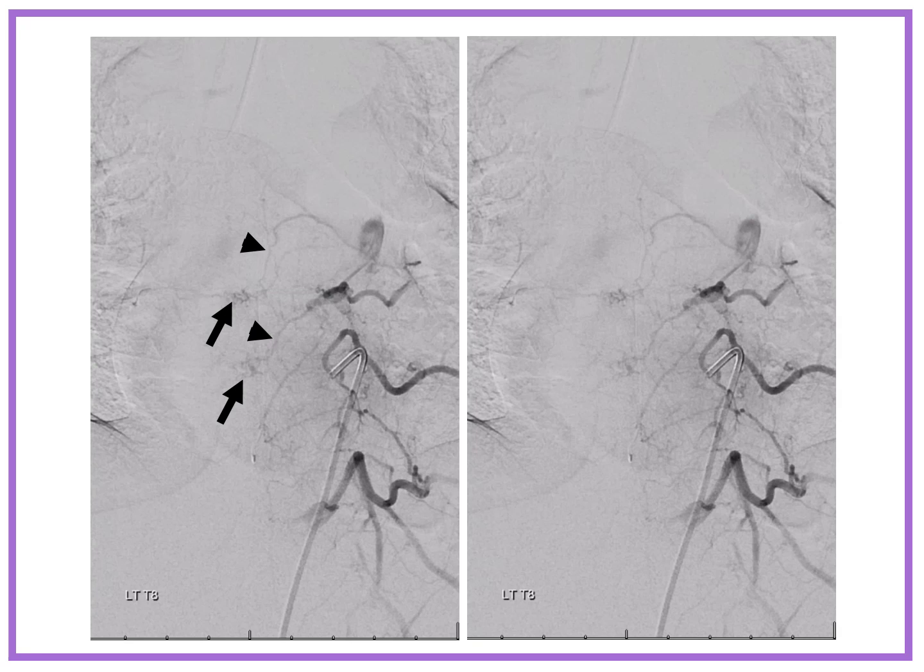So here, what we wanted to point out is these tufts. You see these black arrows pointing to these funny tufts. What are they? Are they fistulas? Are they tumors? Are they what? They are nothing. They're basically supplied to the back of the vertebral body.